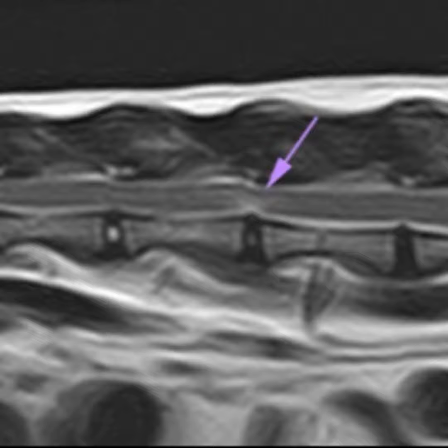that was outside the spinal cord segment of the neurolocalization, but included in the MRI field of view. Both these 2 cats were diagnosed with intervertebral disc protrusion in the clinically affected segments, and the additional intervertebral disc herniation was also an intervertebral disc protrusion. It's therefore possible that our cats affected by intervertebral disc protrusion could have presented more protrusions along the spine, leading to a possible underestimation of the real prevalence of this protrusion in our population of cats.